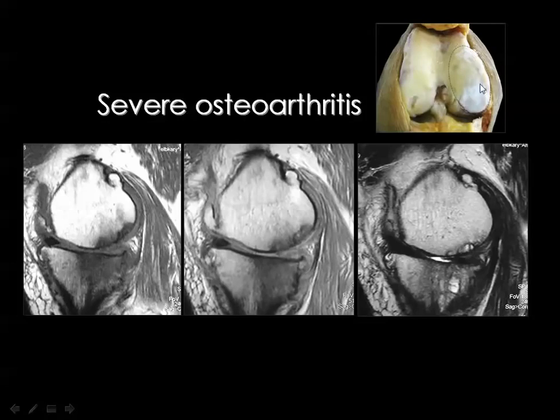Denudation meaning that the cartilage is totally degenerated with loss of its normal thickness, loss of the water content, ulcerated surfaces, and these ulcers may reach the underlying bone. And here you can see this is the articular cartilage of the femoral condyle, which has been totally lost here, and the result is the development of multiple subarticular pseudocystic changes, which are common in severe cases of osteoarthritis.